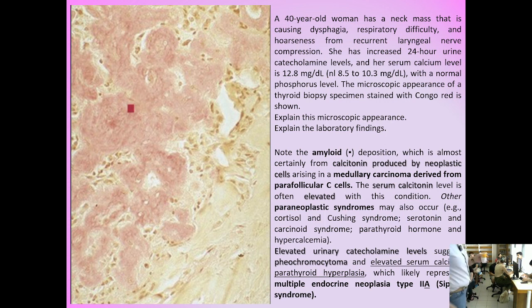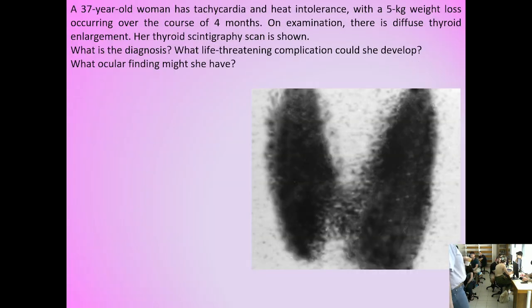Turn it off, please. So here, what is this examination? Which gland is this? And why is it so dark? What do you think? Which gland do you recognize here? Yes, thyroid. And you remember this test that we discussed yesterday? What is this? Yes, we have a scan. And remember that this iodine is different from the one we give to cure thyroid cancer deriving from follicular cells.